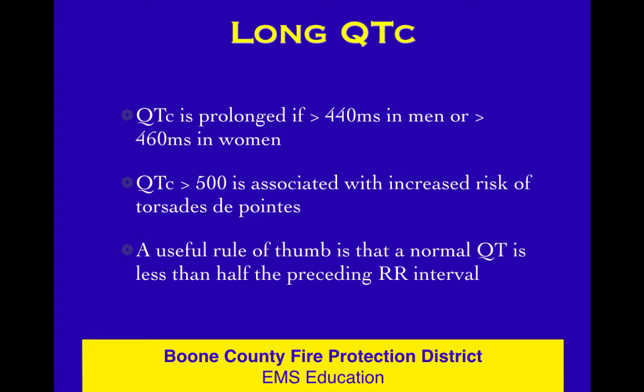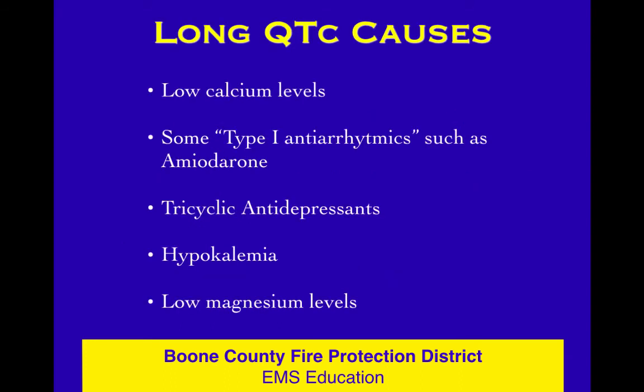I like to let the 12-lead machine measure the intervals because it has digital calipers, it's never wrong, and I don't miss long QTs if I'm disciplined enough to do M for measurements. I do R for rate and regularity, I do P for what are the P waves doing, is there a P for every QRS, a QRS for every P, and then I do M. I do it the same way every time so I don't miss stuff because my eyes will deceive me, but if I will read those numbers, my brain will get it right.